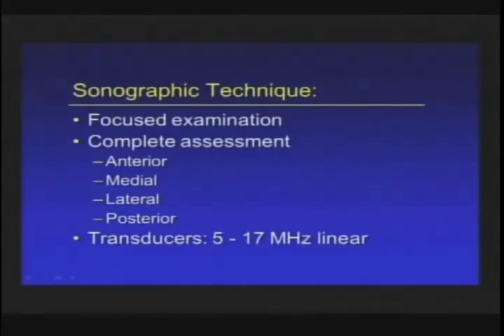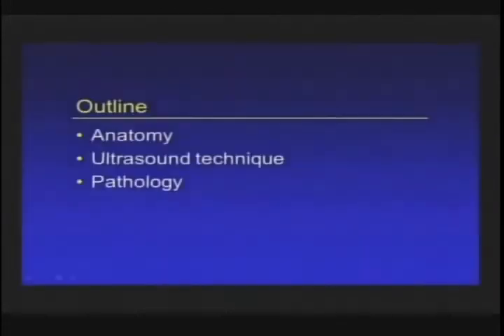Usually the transducer size, the megahertz is 10 megahertz or greater, because the structures are very superficial. So I'm going to briefly talk about anatomy and then move right on to pathology, which will be most of the slides.